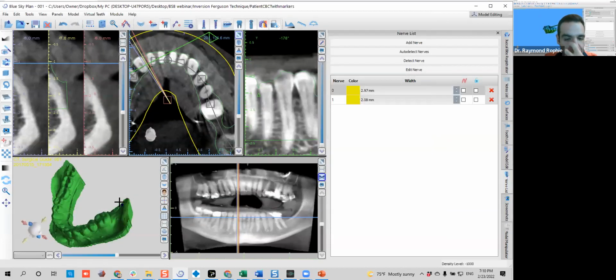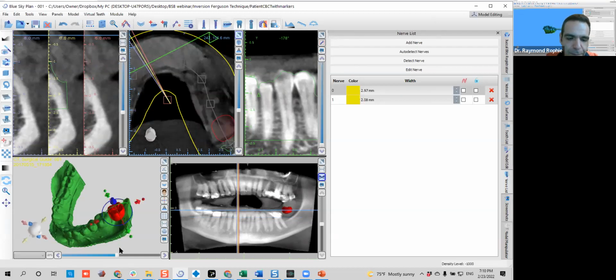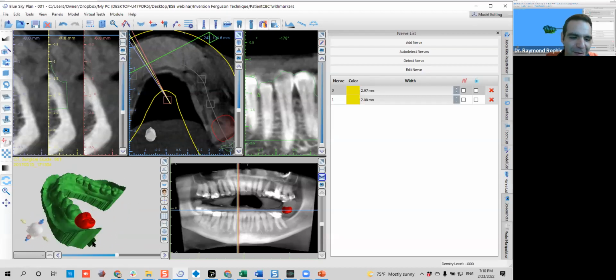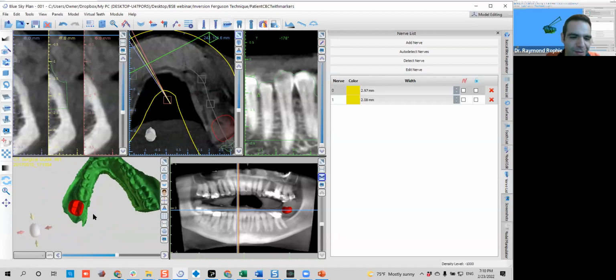Once you click OK, you will see this mouse cursor that is a cross with a tooth. This will add a tooth. There's a plus sign with the tooth, so you will add it. You will left mouse click. You will click with your left. You understand?